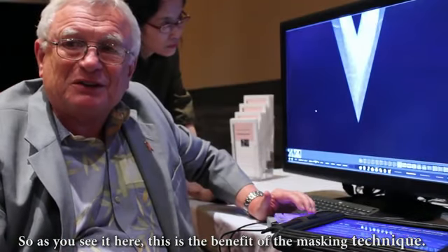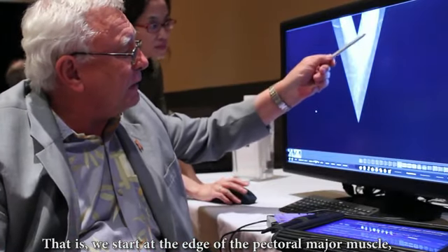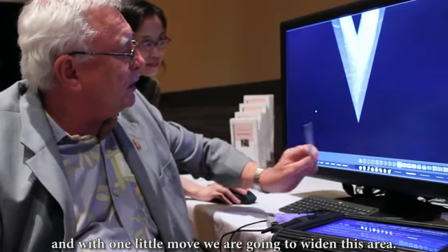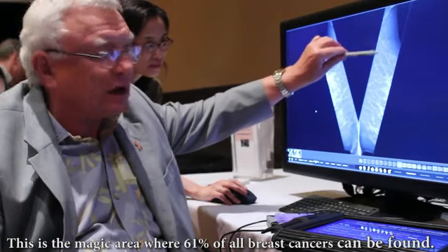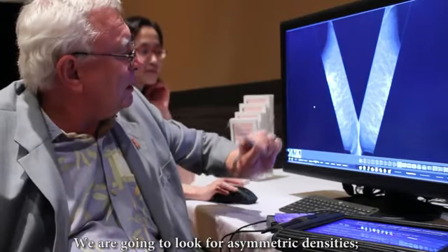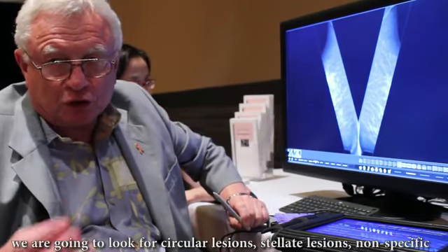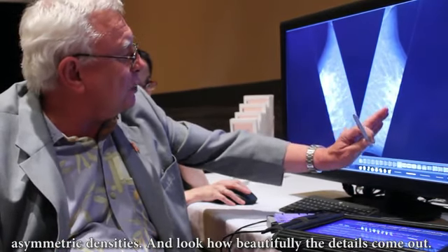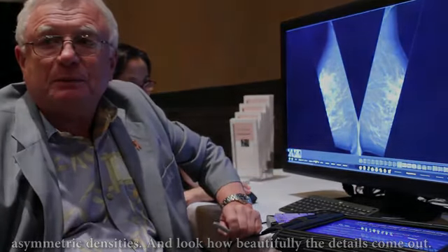So as you see it here, this is the benefit of the masking technique. That is, we start at the edge of the pectoral major muscle, and with one little move, we are going to widen this area, and this is the magic area where 61% of all breast cancers can be found. We are going to look for asymmetric densities. We are going to look for circular lesions, stellate lesions, non-specific asymmetric densities. And look how beautifully the details come out.